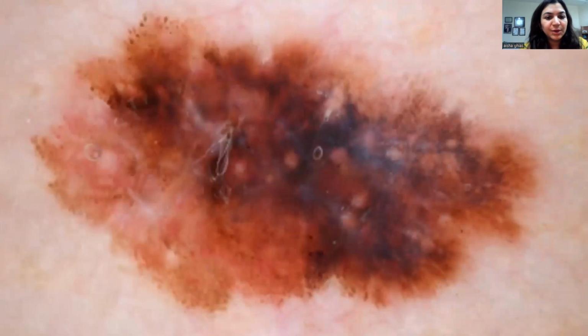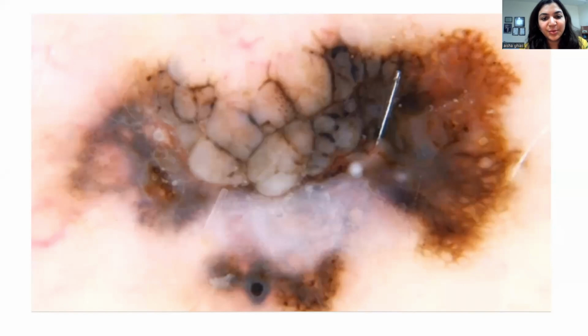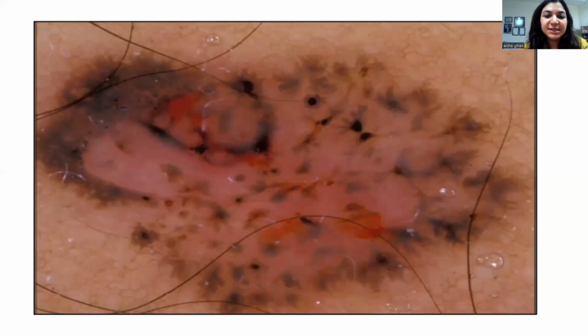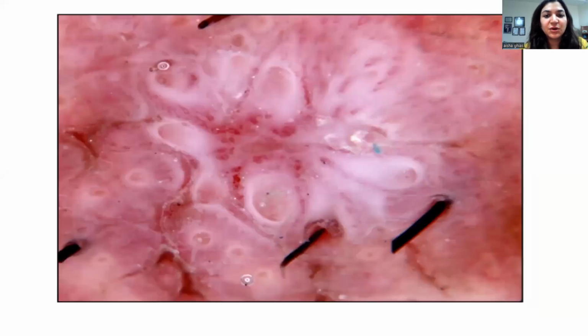Elephant for melanoma. So many structures, different arrangements, and obviously chaotic, non-symmetrical, range of colors, melanoma. Okay, ये तो हमने पहले ही देख ली. We started the presentation with this picture. So this is obviously melanoma. What is this? Elephant for SCC. Yes, this is an SCC.